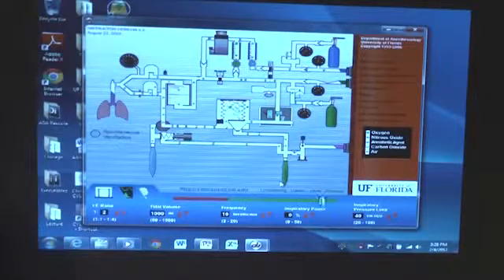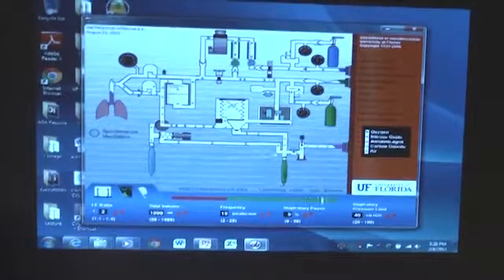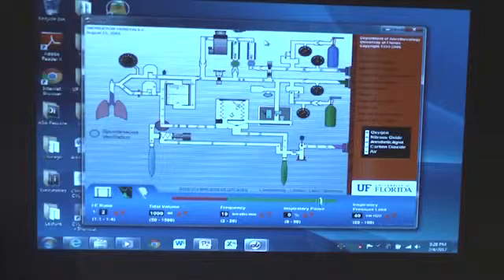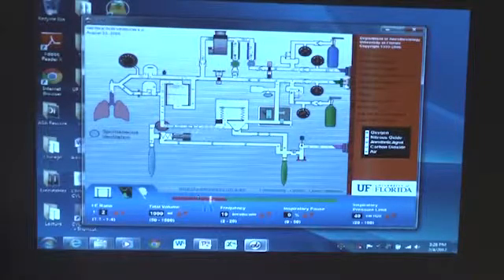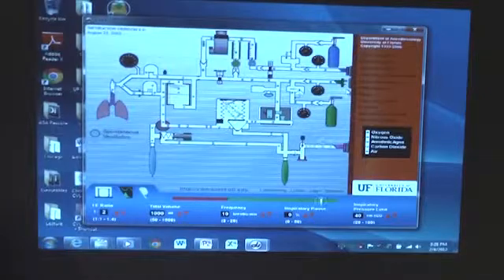Kinked oxygen line or wall. All right, but you guys are having the benefit of seeing everything in 3D right here. Sorry, let's assume you don't see it. What really happened here is this is what we did. So we'll remove that. But I'm going to create a pipeline failure, an honest pipeline failure.